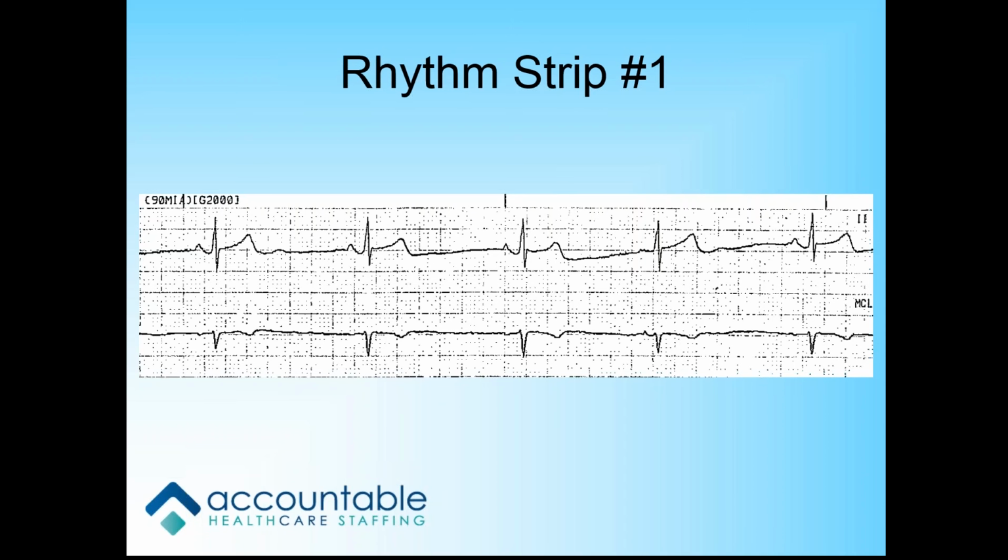And Sam, do next. So we've got sinus brady here. I'm going to give you a little tool to use. It might help you with medication dosages, and it might not, but it's one that I find is of value. When you're looking at your ACLS medications, if you have a beating heart, you cut all of the medication dosages in half. If you have a dead heart, you give them the full dose.